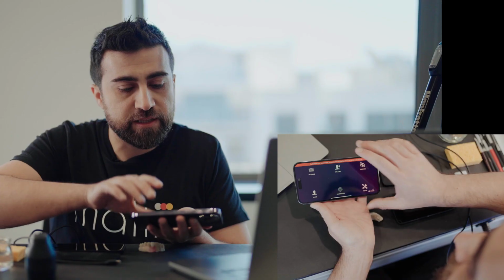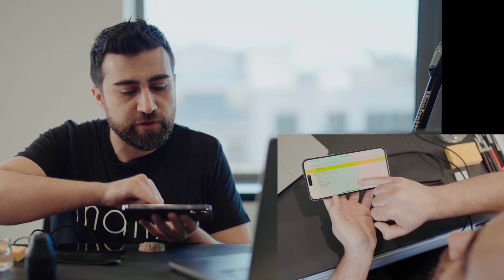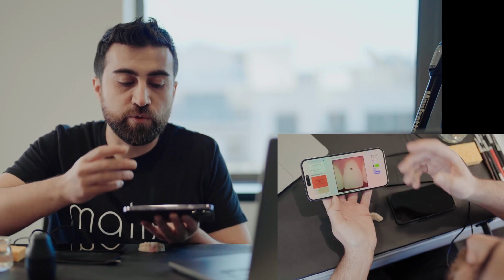In this video, I want to show you how to use the Matisse Staining Studio together with Optishade. The first thing that you need is the picture that you receive from the dentist with Optishade. The picture I already received is in my gallery here. This is a picture of the target tooth that I received, so I will try to replicate this tooth using Matisse Staining Studio.